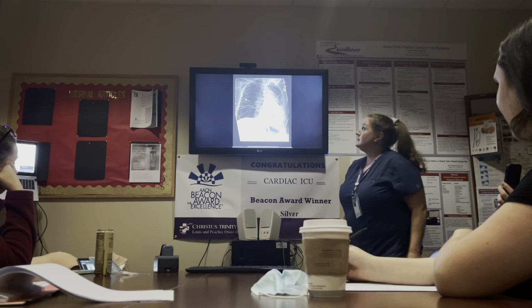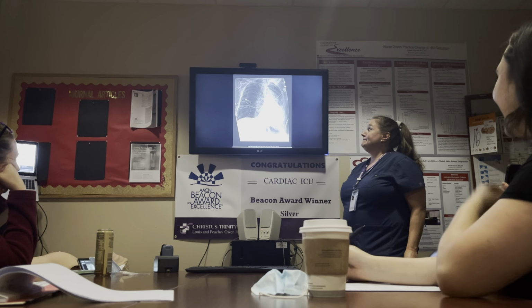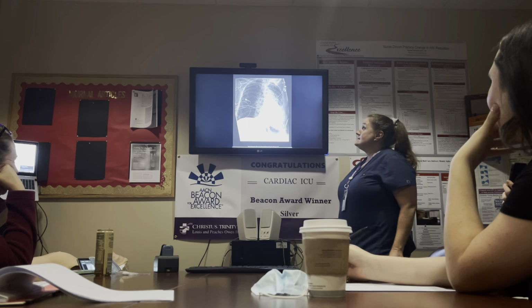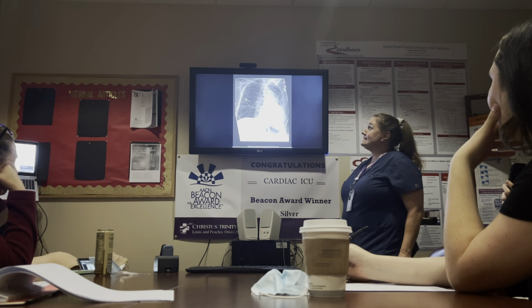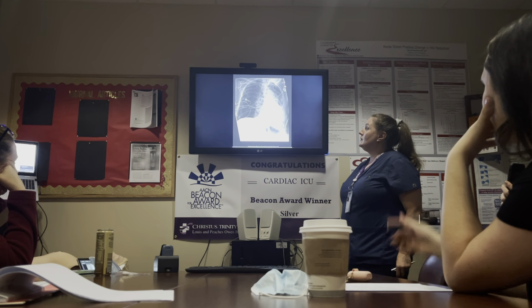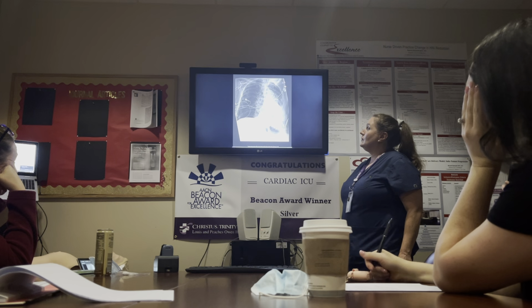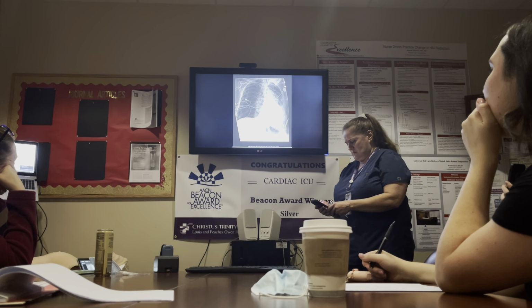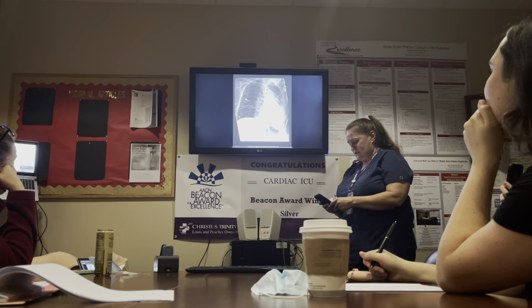Okay, this is a problem. There's a lot of things going on in that chest. Is that stomach, like intestinal? That's tube feeding. That's tube feeding. Sorry, the nurse manager from the other unit.